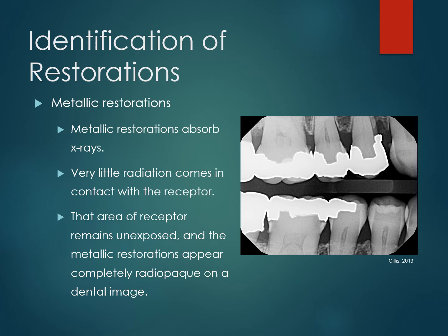And a metallic restoration is the most dense thing we're going to put into someone's mouth, right? And we know that if it is very dense or the most dense, then it's going to show up the most radiopaque, right? Because it is so dense, when the x-rays travel to go to the receptor, the metal will actually absorb it, and it won't allow the x-rays to penetrate through and get to the receptor, which means it won't energize those crystals and it won't turn black. So in those areas where it is bright, bright white, that is metal.